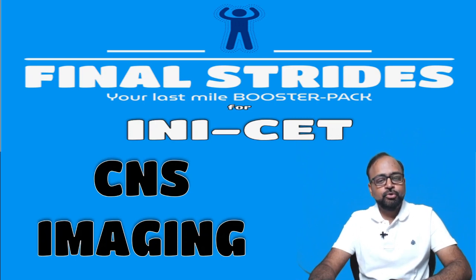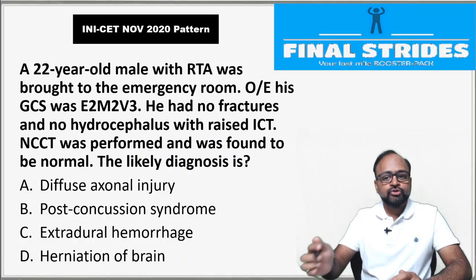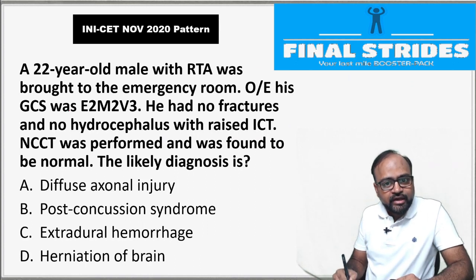Hi friends, a lot of questions are also asked on neuroimaging in your particular exam. So let us deal with a few important topics as far as CNS imaging is concerned. Look at this recently asked INI-CET pattern question.